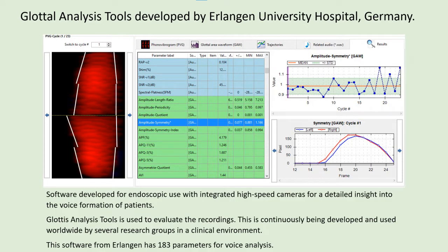Glottal Analysis Tools were developed by Erlangen University Hospital, Germany. It is software developed for endoscopic use with integrated high-speed cameras for a detailed insight into the voice formation of patients. Glottal Analysis Tools is used to evaluate the recordings of high-speed video. This is continuously being developed and used worldwide by several research groups in a clinical environment. This software from Erlangen has many parameters for voice analysis.